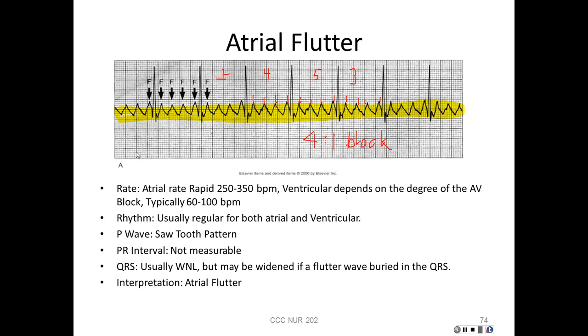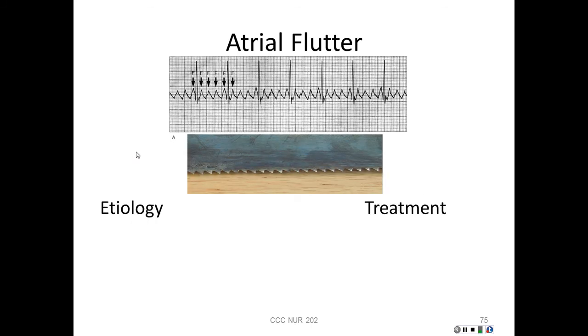Again, as we look at the sawtooth comparison, these are the teeth of just a normal old-fashioned handsaw for cutting wood. And you can see if you flip that upside down how that looks very much like these problems.